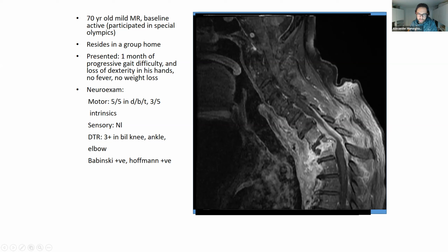I don't see any contrast sparing, but the tissue goes from prevertebral through the spine into the canal, and the enhancement posterior to the cord could be reactive, could be tumor. Posteriorly between the spinous processes, which seem to be intact, there's also a lot of contrast enhancement. It's strange. I can't tell you the diagnosis from the MRI. So here are the labs.